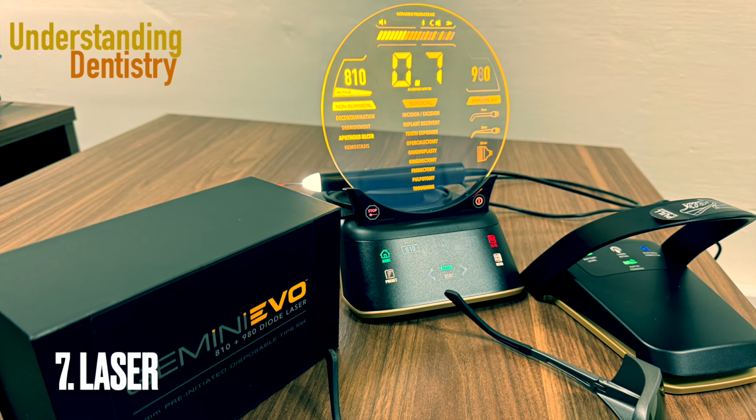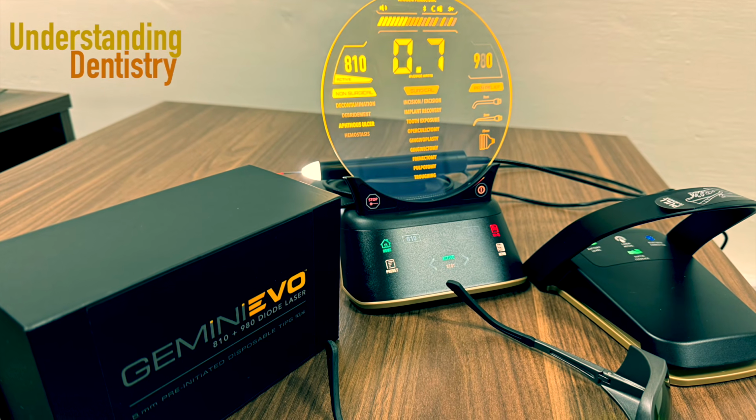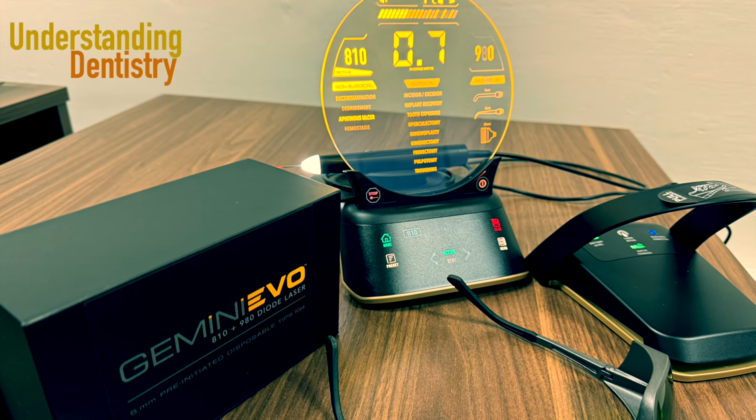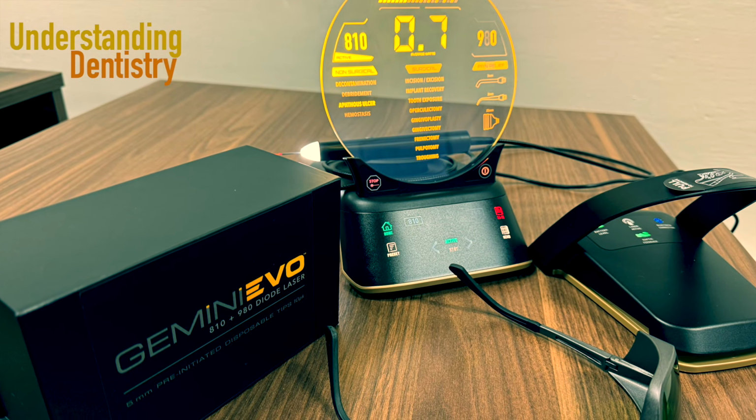And just for us to finalize, the nice laser, okay, so we have laser, we already have a video about this, showing a lot of clinical procedures that can be performed using the laser, okay?